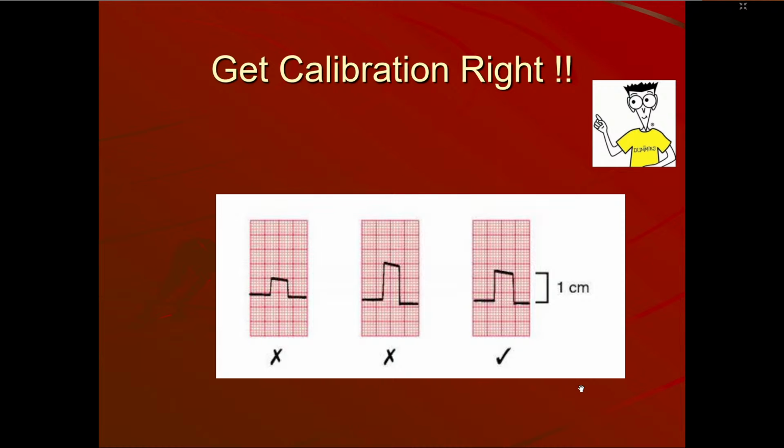And sometimes, like in this first complex out here, you see it is just 5 small squares. So in this person's ECG, if the R wave in any lead, let's say V5, is 20 small squares, actually the R wave is 40, because this is 5. We have to calculate for 10. So you double. Okay, so it is very important.